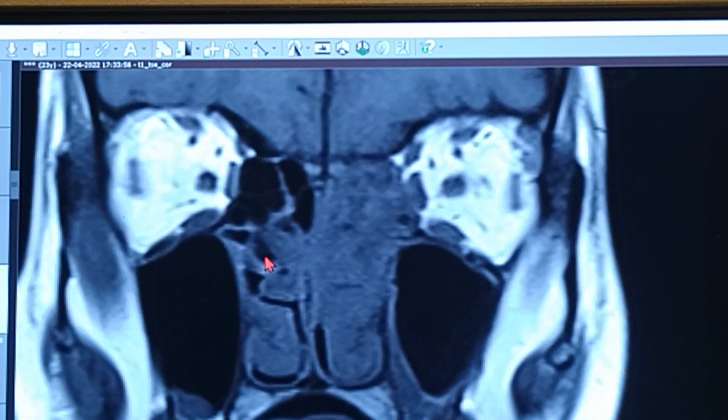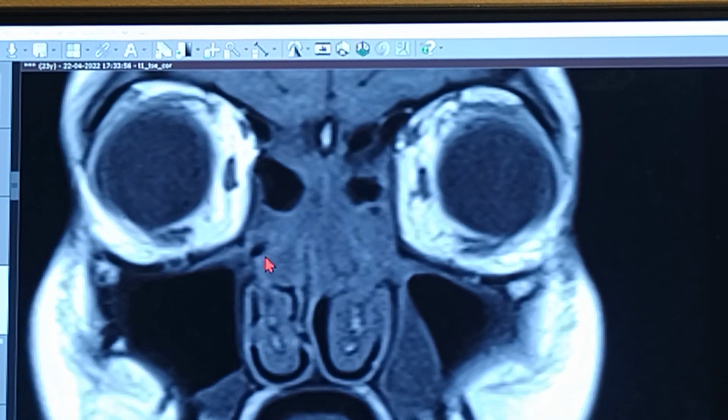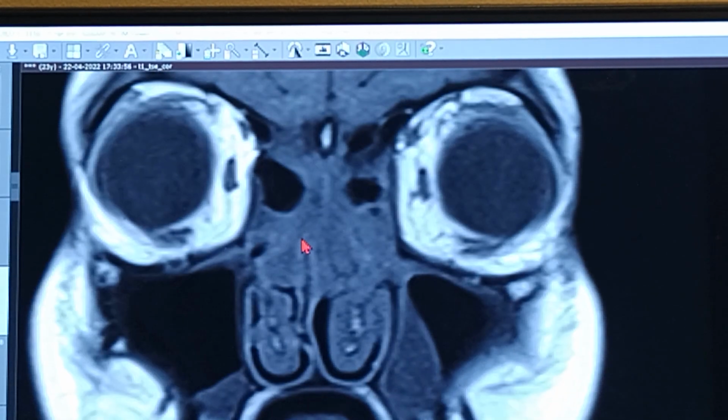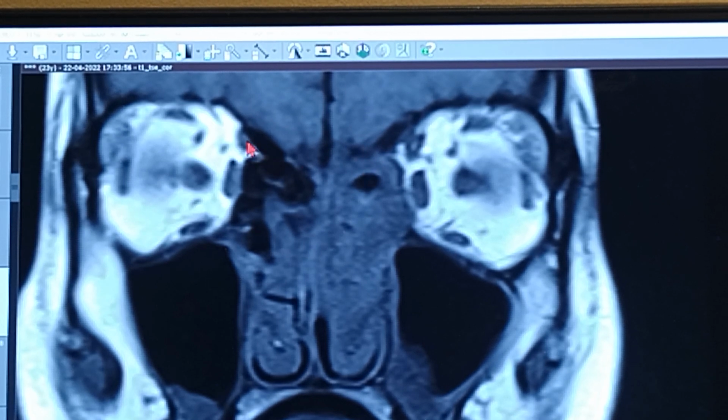Now coming back to the anterior ethmoidal artery level, it should be almost anterior to the end of the anterior ethmoidal skull base. So somewhere around, if you keep on going behind, this should be the area. You can see an actual convergence over here. That's the Kennedy nipple sign on CT scan, but on MRI as well you can see this is the superior oblique right here.